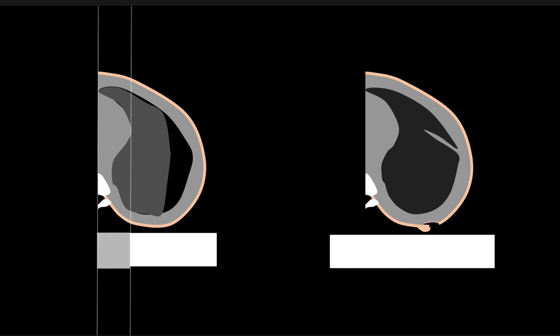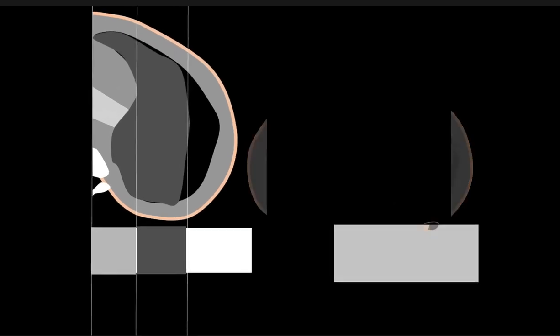All right, now let's see what happens. We'll put some x-rays through here onto that film, and we'll look slice by slice at what happens. We'll start with the pneumothorax guy. So everything over here, we'll just make that black so it's not confusing. First cut here, that's primarily soft tissue through the heart and the hilum, so that's got soft tissue density. And this portion here is more of the lung, that's the partially collapsed lung from the pneumothorax. And then we'll zoom in here.